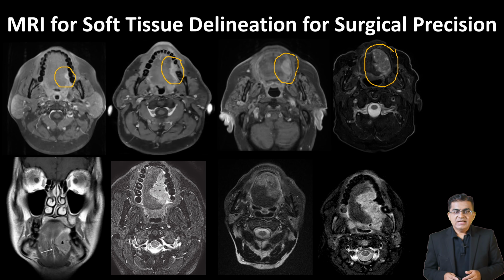Patient 5, a large left lateral border lesion seen here in the coronal view. It involves the entire thickness of tongue. The tumor reaches the lingual septum and is slightly pushing it, but it shows no signs of infiltrating or crossing the septum. Patient 6, bottom left. Now we see a bulky tumor expanding the left half of the tongue and it is severely pushing against the midline septum.